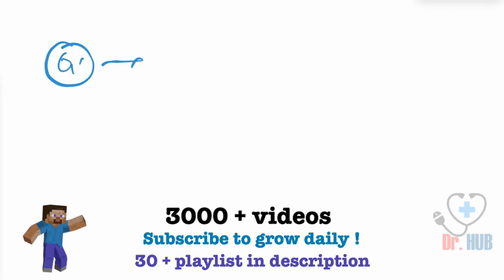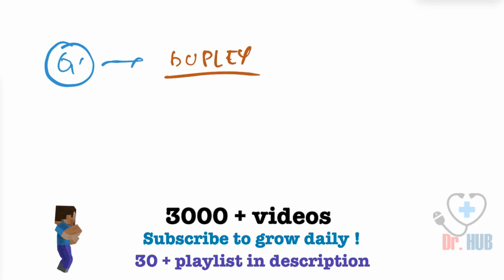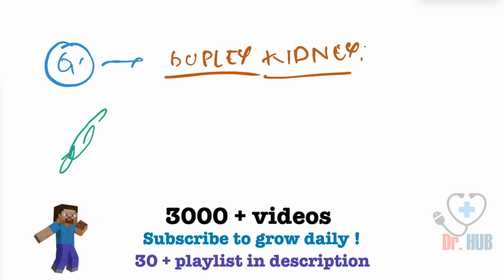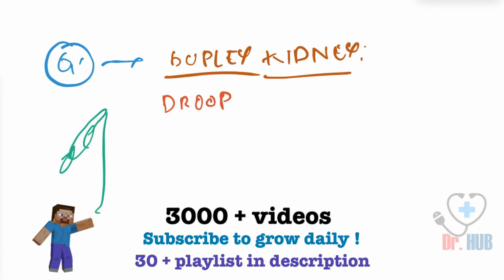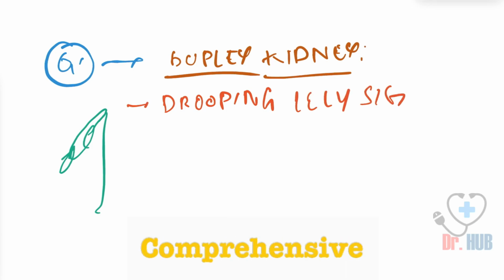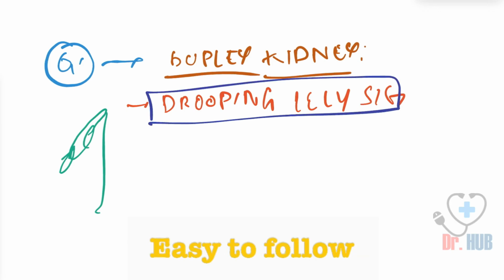Now we'll move on to answering our questions. The very first question we asked was, what are the signs seen in the intravenous urogram for the duplex kidney? There is a drooping lily sign. This is a very significant and very first keyword of this duplex.